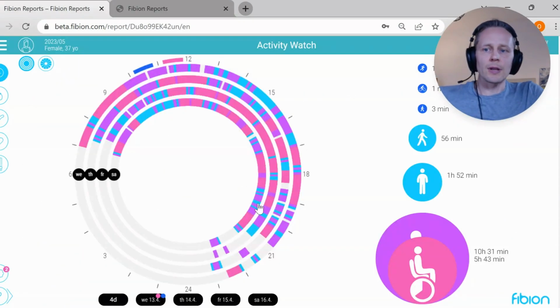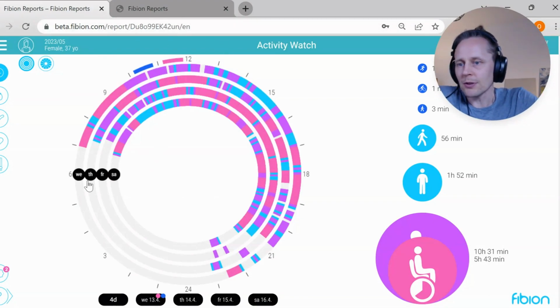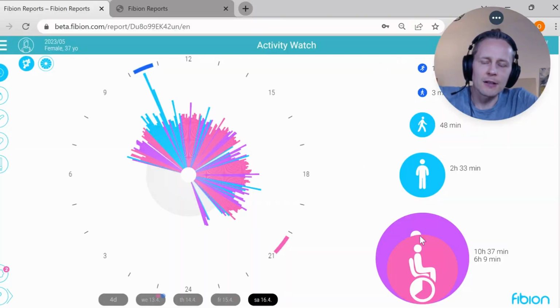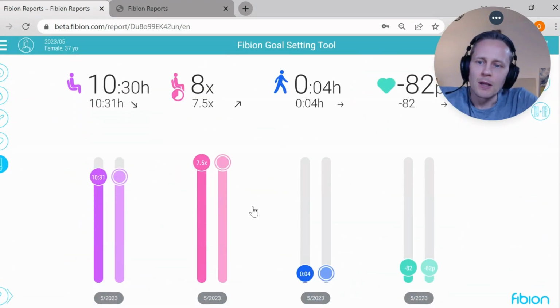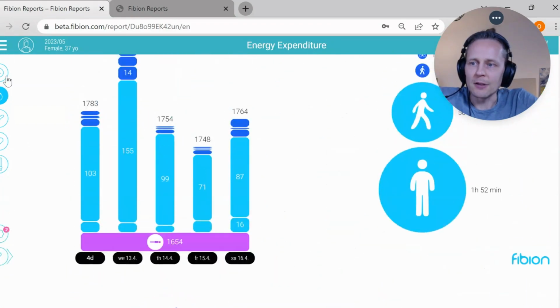And so these ones we call Fibion online participant reports, and basically here are interactive online reports. You can click different things, days, and the variables are changing. There is another video explaining all the variables, but there's quite many things that you can do in the reports.